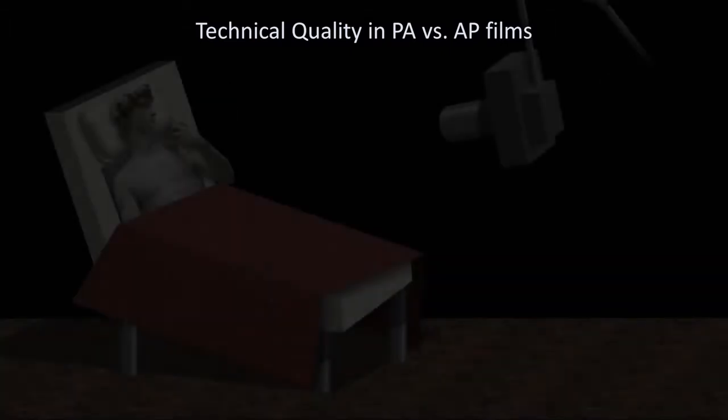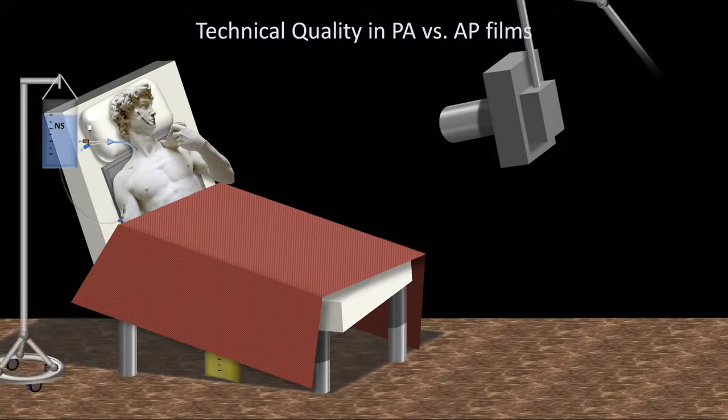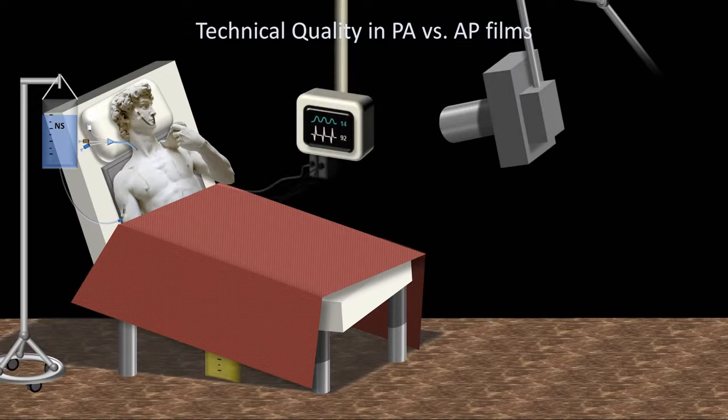In contrast, the AP film is taken of a sick patient in his or her hospital room. The patient may or may not be able to be positioned in an optimal way due to illness or immobility, and may not even be cooperative. There may be lines and tubes that the radiology technician needs to work around, maybe an attached IV pole or overlying telemetry leads.